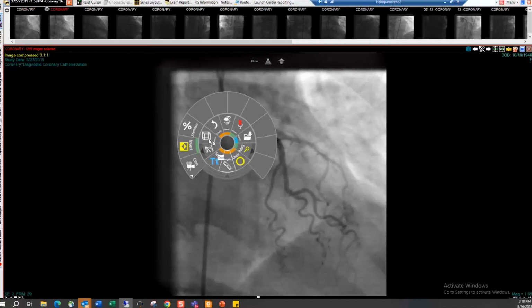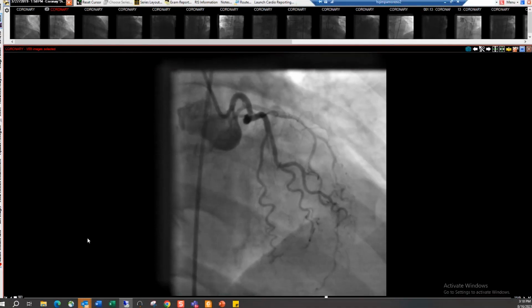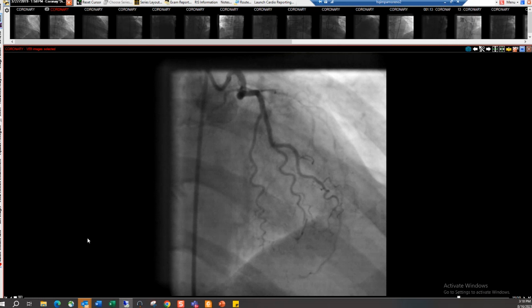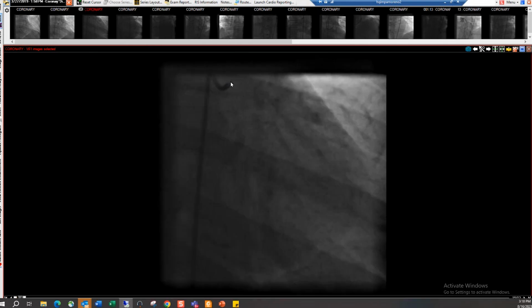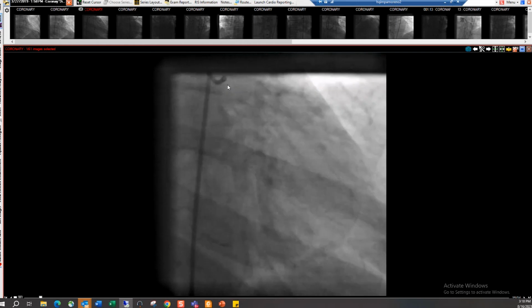And the other thing is that what I'm seeing is that it's not playing smoothly, and that's not to do with the viewer. It's Teams is not able to keep up with the frame rate of the computer. You would expect to see these play smoothly as they go. There's no lesions here, Tony, so it's going to be kind of hard to do an analysis. But the point is that the analysis tool exists for those who want to use it.